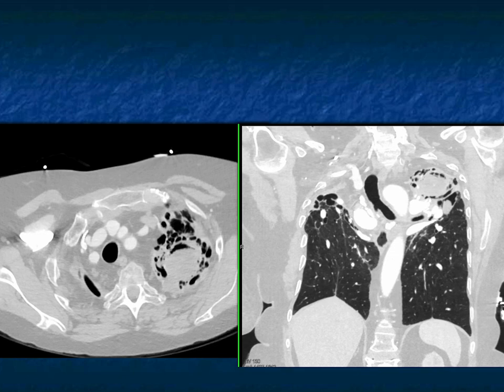And then there's a cavitary lesion with a solid component in the left upper lung. There's some air bronchograms present. So I'm thinking here of infectious etiology. TB is a thought. Sarcoidosis is a thought. You notice how the rest of the lungs look pretty good except for this retraction upward. Again, I'm not thinking malignancy. Other infections, coccidio, aspergillosis, classic aspergillosis in a sense, we're not thinking about that. It's not going to be COVID, obviously.